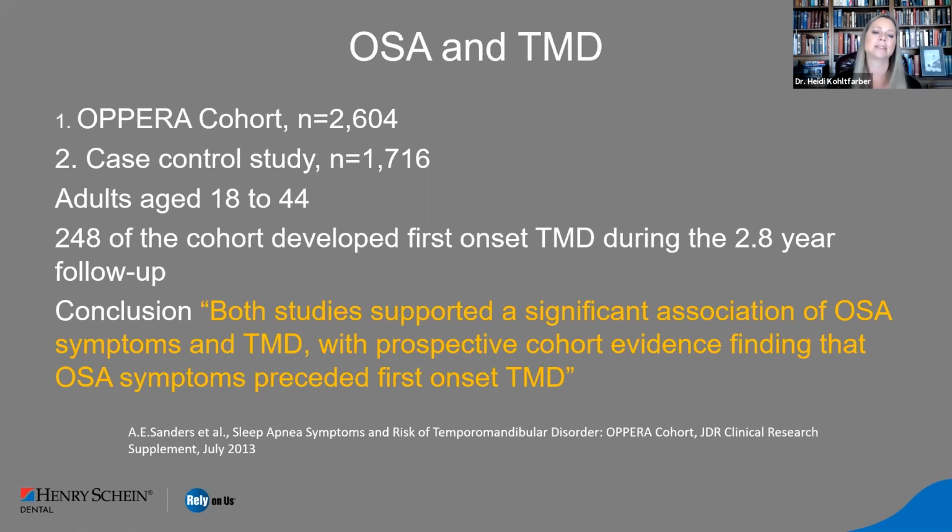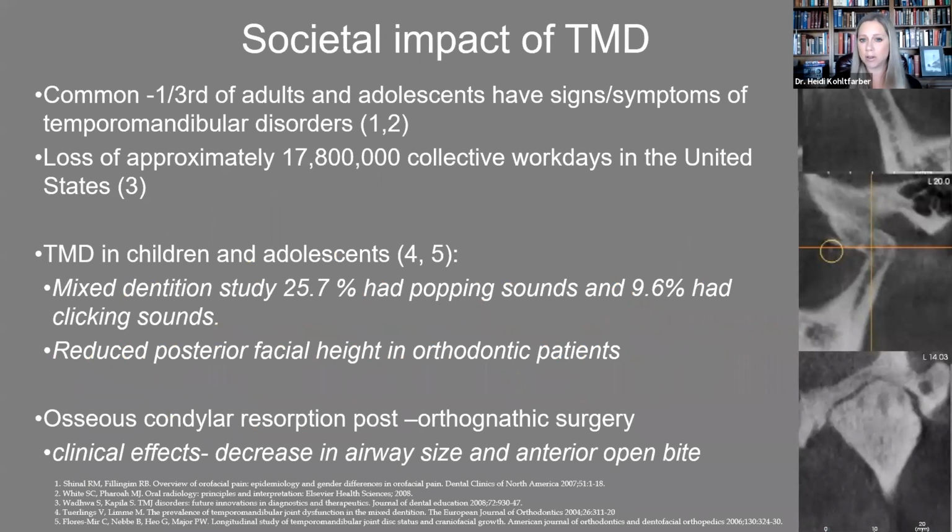So what does that imply? It implies that our treatment may have caused some TMD issues in the patient. And again, maybe we did not situate the condyles where they needed to be. And so I would always look at the condyles. I would always check the condyles. I would monitor these patients. What they actually found is that we can tend to see osteoarthritic changes within about 6 months. Now, our clinicians will tell us that they can't really tell that there's a change or a problem with the patient unless they complain of symptoms or they start to see occlusal issues. And it can take up to 3 years to see occlusal issues with that particular case. And by that time, there's quite a lot of damage to the condyles.